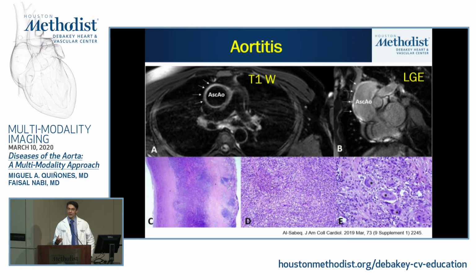There's a lot of interest in CMR, with gadolinium contrast, both non-contrast and with contrast techniques. This was a study published by our own Dr. Al-Sabik, who showed very nicely findings of aortitis demonstrated by cardiac MRI. Here on a T1 image, you can see a very bright, intense T1 intensity on your T1 weighted images. And then when you look at your LGE, you can see hyperenhancement of the ascending aorta.